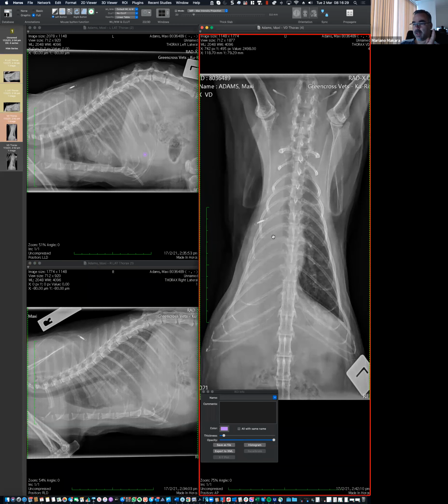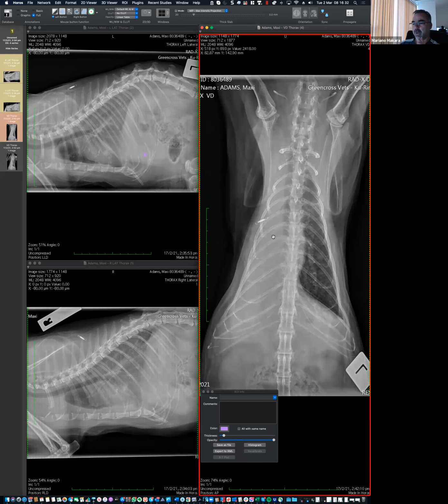I'm now talking about the hypothesis of whatever is going on in the right hemithorax being pleural effusion. So if we want to play that game, then what would be expected are these two things that you were mentioning. One is that usually there is nothing in the pleural space, so if we're going to add more stuff, then we usually want to see a mass effect. Makes sense?